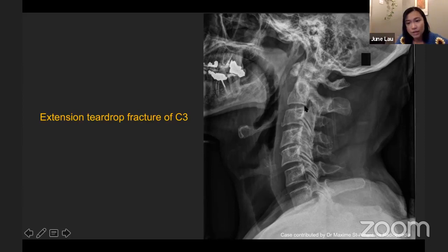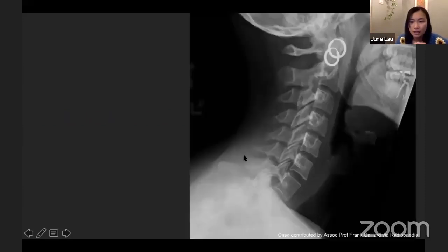The posterior line is still maintained, and your spinal lamina line, which is this, is still maintained. There's no step on it. It looks really degenerative with osteophytes and things like that, and that's just how old necks look. And here your spinous process line is also well maintained. Okay. How about this one?